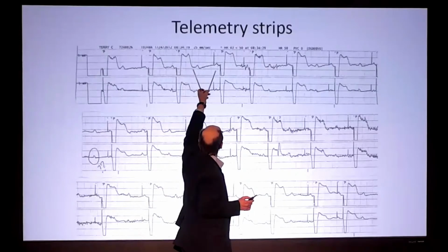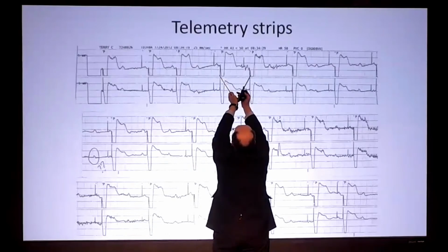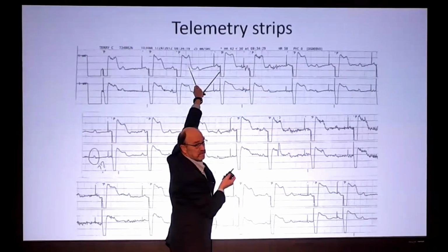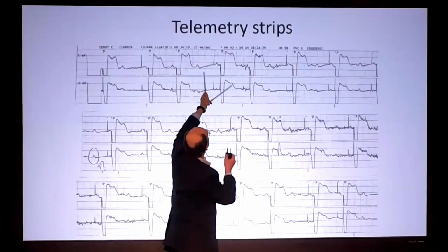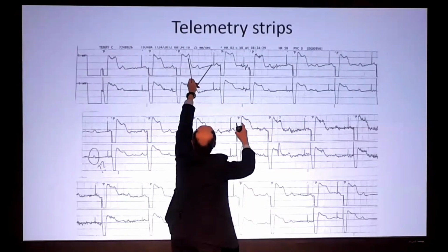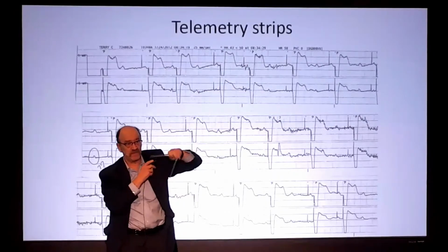So let's go backwards and go to the lower rate limit here. Here's the V pace, and go backwards. And where do you end? Where does that land me? It's before the other P wave. Or what is that, electrocardiographically? Right on the T wave, right? So if I go V pace to A pace here and go from the T wave to A pace, the numbers are perfect. Remember, measure twice, cut once, measure that.